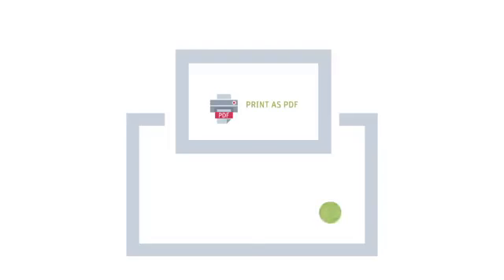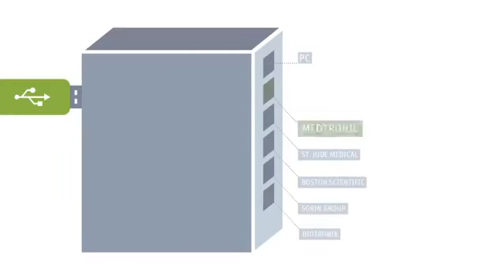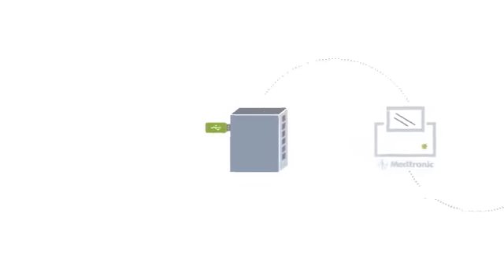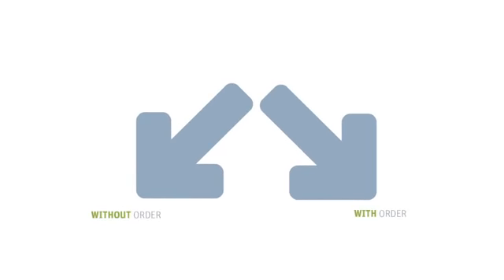In addition, a file with the measured parameters has to be created. The data and the PDFs are then saved on the USB stick connected to the switchbox. After that, the user has to change the switchbox setting from programmer to PC by pressing the corresponding button. Now, MediConnect will import the data. This can be done in two different ways.